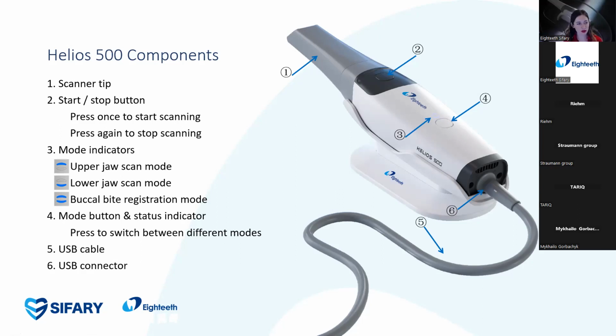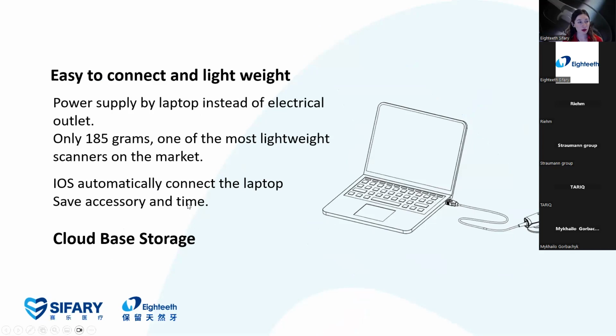And of course, USB cable and connectors. I'm going to show details later on, yeah. So very easy to connect and very lightweight. It's only 185 grams. You can take this down as a note. This is one of the most lightweight scanners on the market.